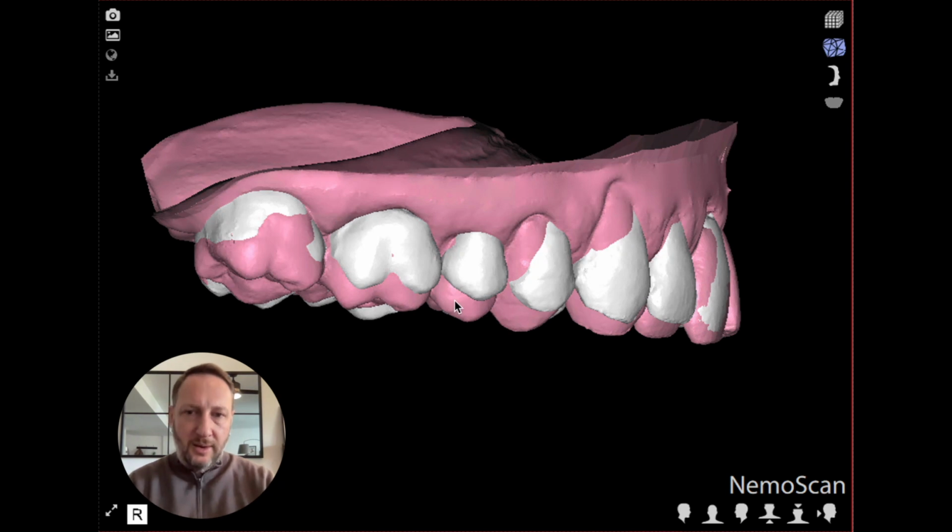And now we have two very important pieces of information to plan the positioning of the mini implants in the most accurate way possible, so they can stand there very stable and without risks for all the teeth. Okay, we have the initial position, of course, but also the final ideal position.